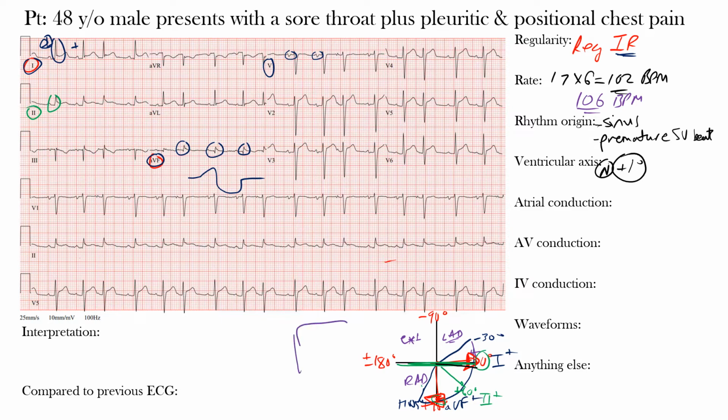Well, remember, with our box here, here's our right atrium. The sinus node is here, and because it's in the right atrium, the right atrium will depolarize before the left atrium. So it will depolarize first because the sinus node is located there, and then come over to depolarize the left atrium. Therefore, when you look at any P wave, the initial portion represents the right atrial depolarization, and that latter portion, which we see here, this terminal portion, represents left atrial depolarization.